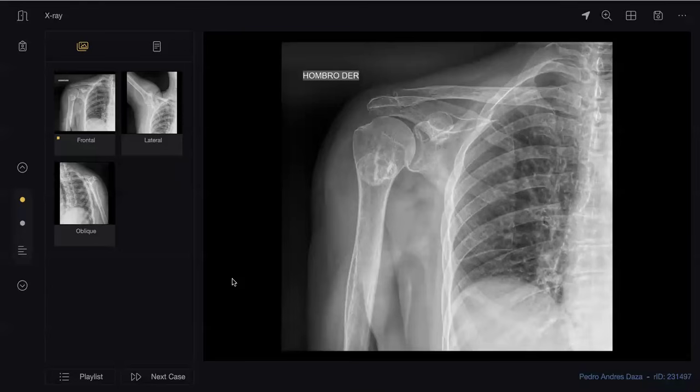It doesn't look like an aggressive lesion. It could be calcification. Any other finding that you see here? I'm not sure about it, but in the rest of the humerus shaft it looks like there are some lucent areas, but I'm not really sure about it.